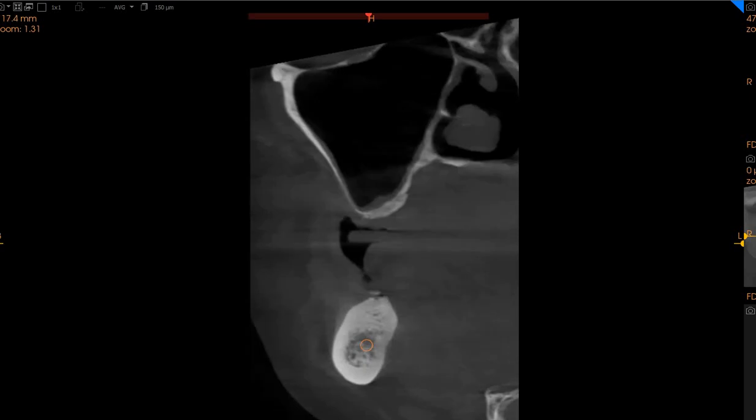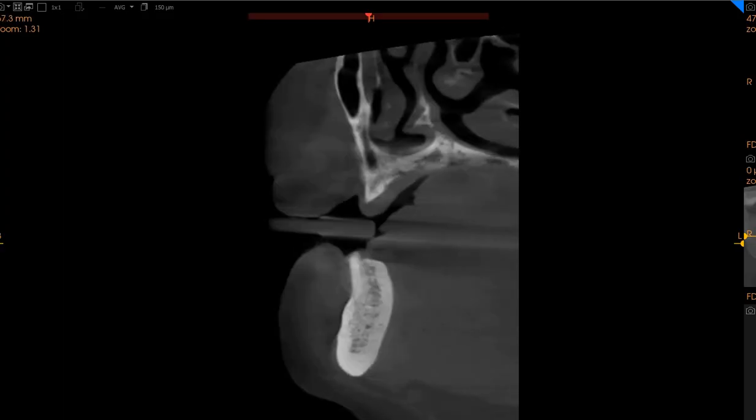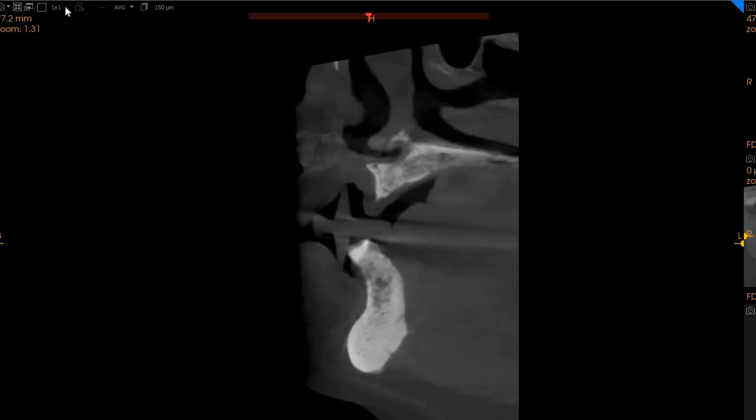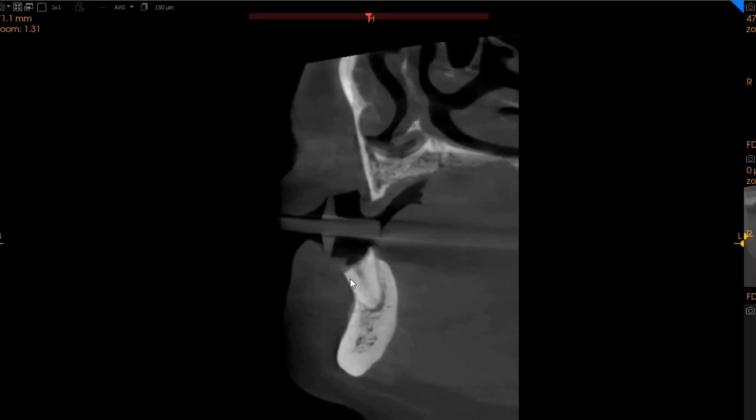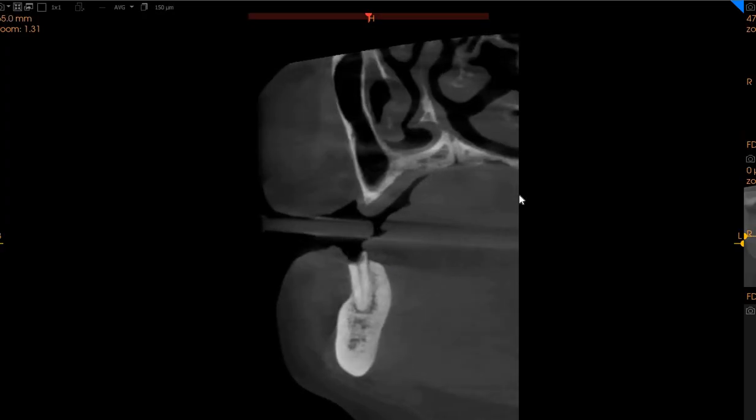Moving to the lower anterior region, starting with the lower right side, this is where we have a slight bit of bone in the central incisor region, 5 millimeters of ridge width with approximately 11 millimeters of height. Moving to the canine region, we've got again a defect present here, ridge width of 9 millimeters and a height of approximately 9 millimeters as well. Moving to the lower right premolar region, again very limited bone. When this comes out, you'll have 7 millimeters of width with 12 millimeters of height and a buccal defect.